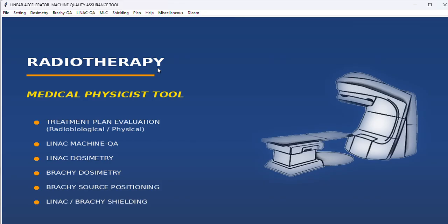So this Python is integrated with the SQL database so as to extract the parameters from the database and store the data output to the SQL database. So both are integrated with each other.